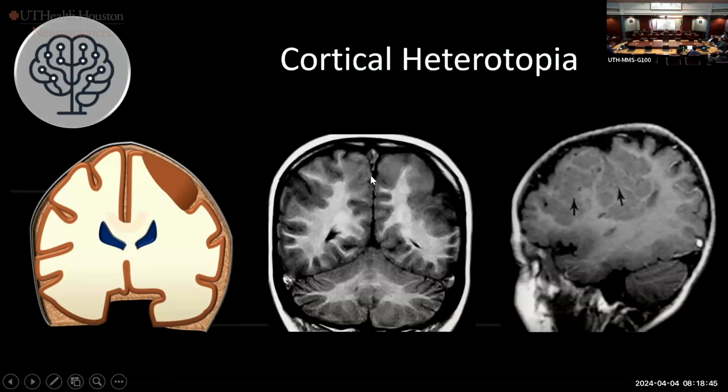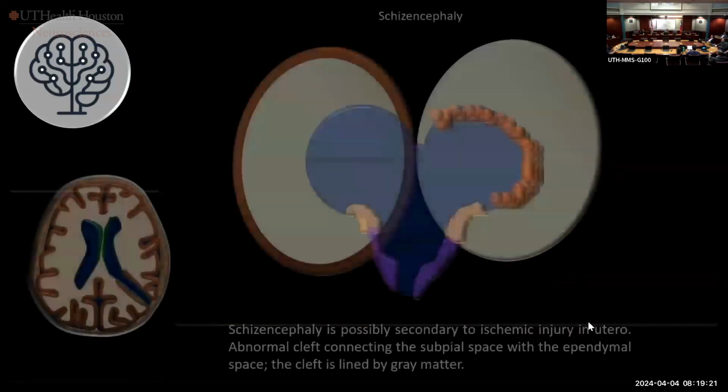And when we're going to talk about epilepsy, you should never just give up when you see one migrational defect. You just have to look everywhere because sometimes you have smaller foci that you could miss just because of satisfaction of search. And a lot of the times, it's the small ones that are actually acting up, and not the bigger one. And we see that a lot when we do the EEGs and the functional studies, which show the foci that are really targeted afterwards for treatment, because they're the ones that are responsible for the symptoms of the patients.